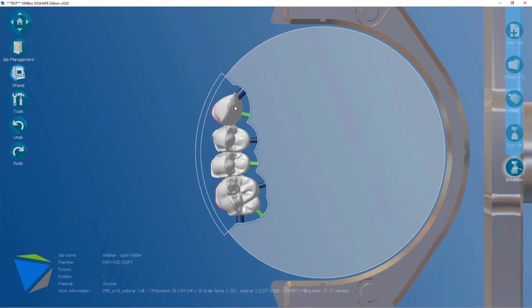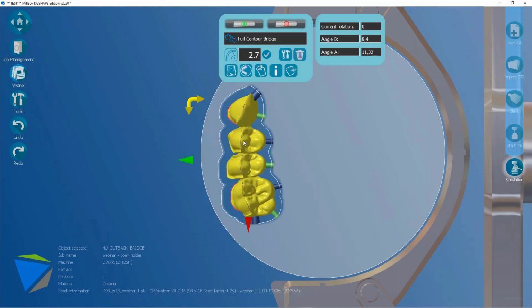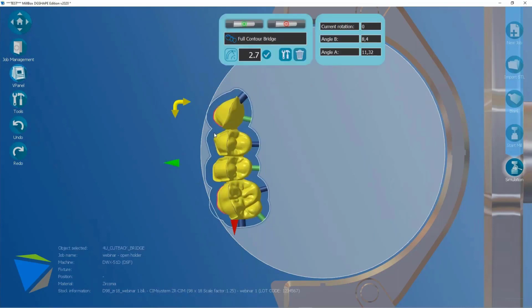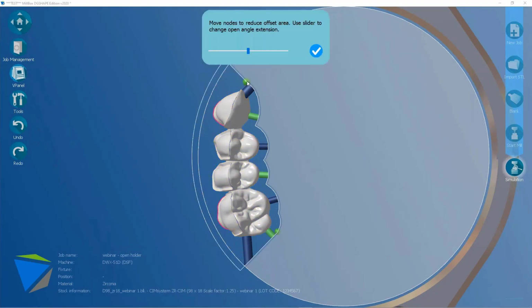Okay, for example, how to use it? It's very easy. Here, let me make an example of how to use it. Let's close it again. For example, I was here, I can put it here, and then automatically, because it's still closed, I use a dedicated command to open it. Thanks to these two jogs, green balls, I can decide which is the area to keep open or closed.